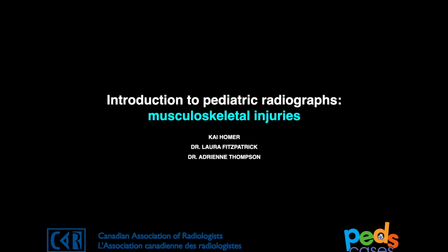Hi, my name is Dr. Kai Homer, and I'm a resident in radiology at the University of Alberta. This video is the second in a series discussing musculoskeletal radiology in children. We're going to focus on musculoskeletal injuries and go through some cases to help you understand how radiology fits into the whole clinical picture. This video will discuss terminology used to describe fractures in radiology, specifically Salter-Harris fractures.